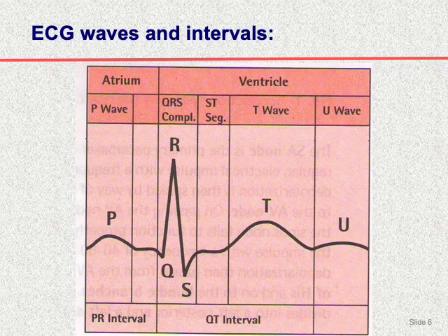And then the P wave is followed by the PR segment, as we see here, and this is an isoelectric segment. During this period the atrium repolarizes, but normally we don't see this effect on the ECG.